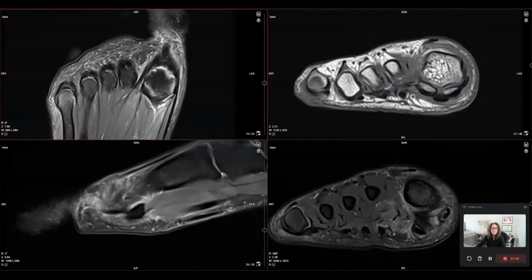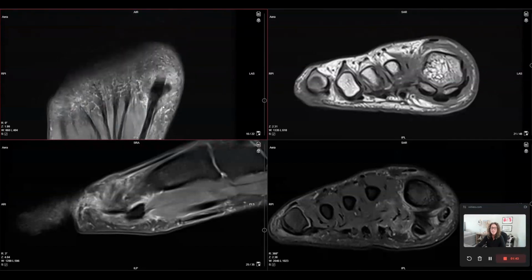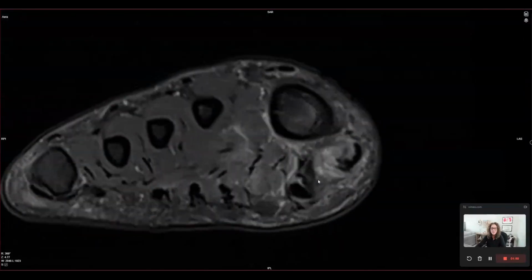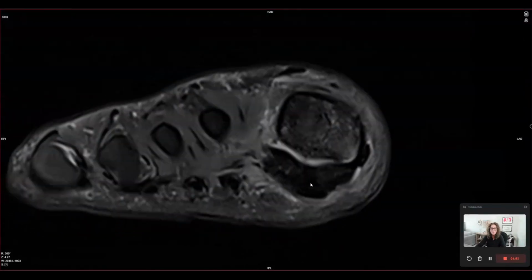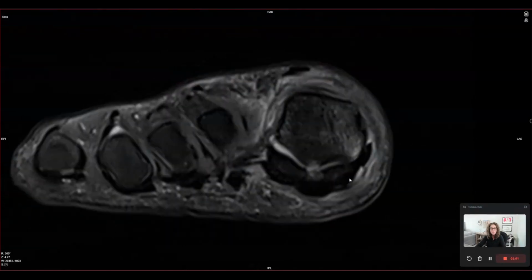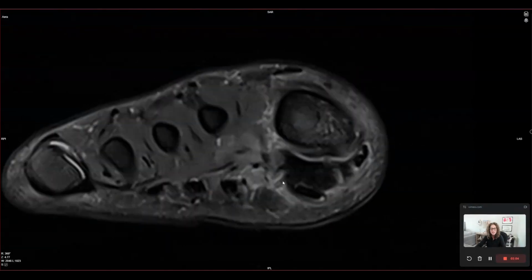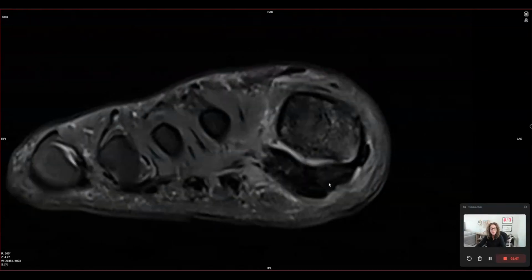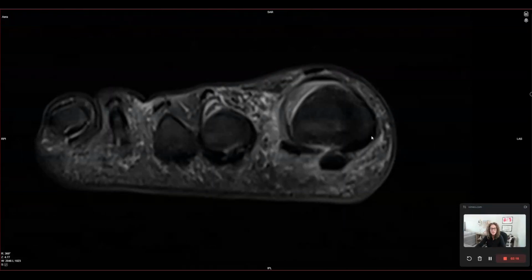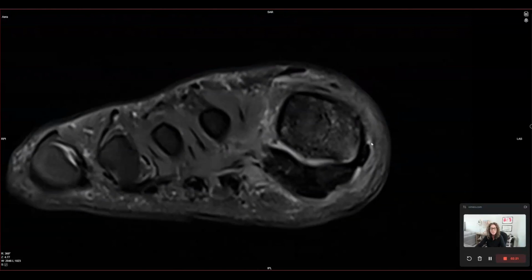Moving in past the edema of the bony structures into the ligament and capsular anatomic changes that are occurring here, let's get oriented by seeing the sesamoids at the level of the intersesamoidal ligament. Medial sesamoid, lateral sesamoid, intersesamoidal ligament. We see the flexor hallucis tendon superficial to that, and of course the flexor hallucis brevis, both the medial and lateral. The sesamoid is invested not only by the flexor hallucis brevis, but the abductor hallucis actually comes to attach on a portion of the flexor hallucis brevis, and the abductor hallucis then will go on to attach to the proximal phalangeal base, providing capsular ligamentous support.